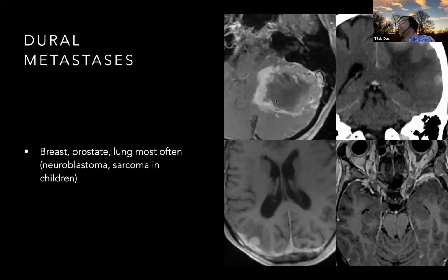So here's a large cerebellum metastasis, and there's a bit of dural thickening, and at surgery is found to have dural invasion. So it's probably parenchymal invading dura. These are METs from prostate cancer, and it'd be extremely unusual to have a parenchymal MET, but dural ones are more common. In this case, there was no bone abnormality associated with it. And this is breast cancer where you've got dural thickening, more diffuse, but also some nodules. And similarly, again, breast cancer, this more subtle dural thickening.